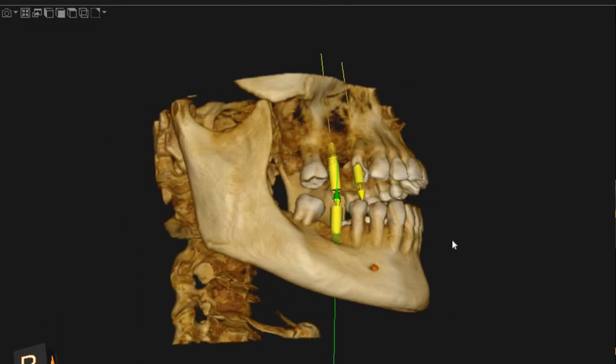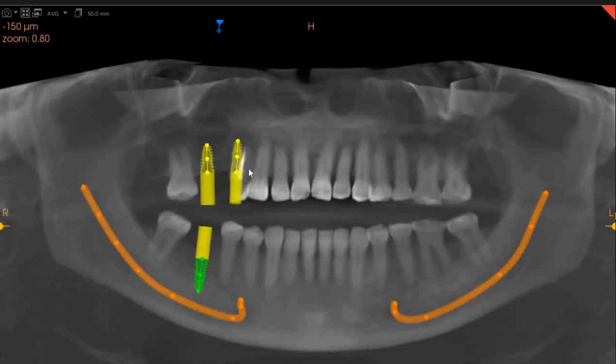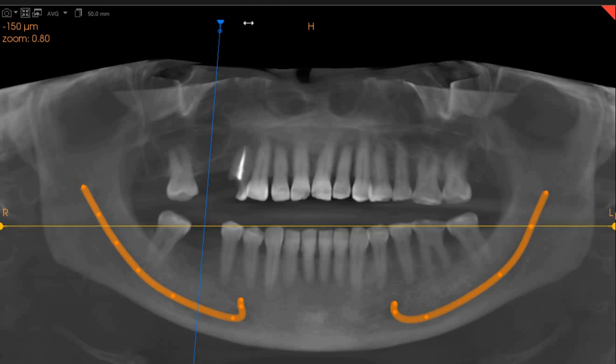In contrast scan diagnostics, say this is the CBCT of the patient that you had requested. The area of interest is the upper right 4, 5, and 6 region and the lower right 6 region. Now we can see that we only have placed two implants in the upper region. We are going to first measure each and every aspect, and then we're going to tell.